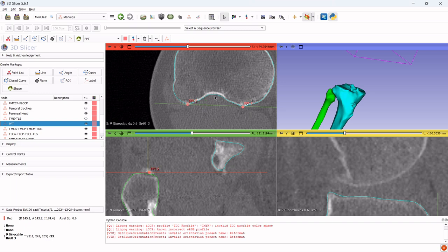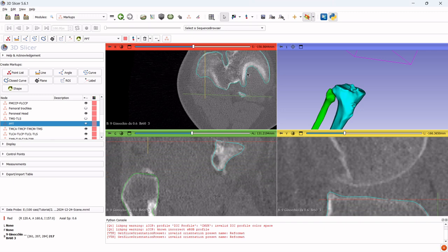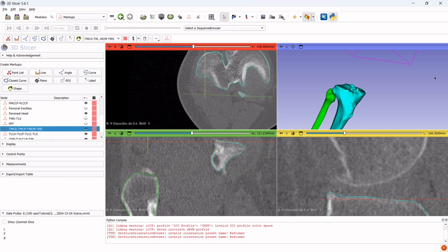On the coronal view, you can see at the level of the red line the posterior aspect appearing. It doesn't matter if there are already some bone structure visible, usually above this red line. We are searching at the level of the fibular head, and we don't care about the most proximal part of the tibia. Then toggle the visualization off. Let the MPR as it is.